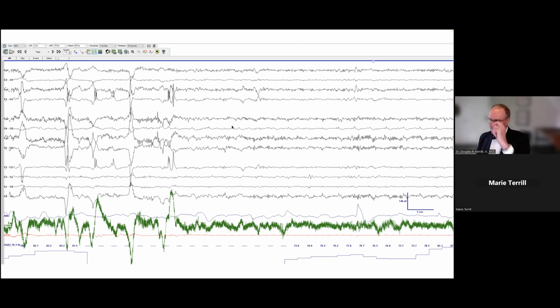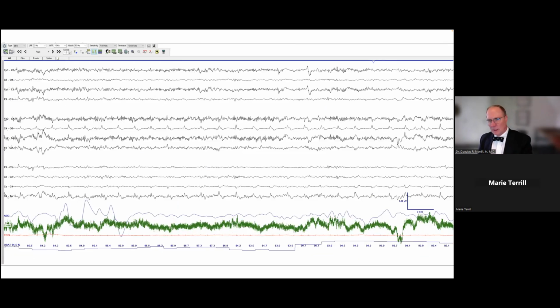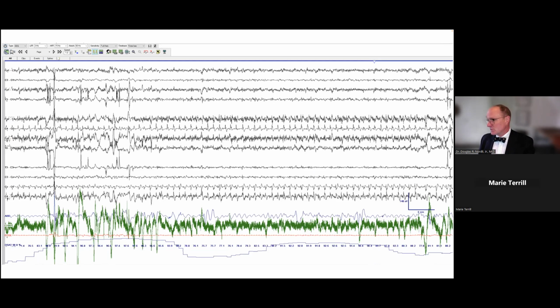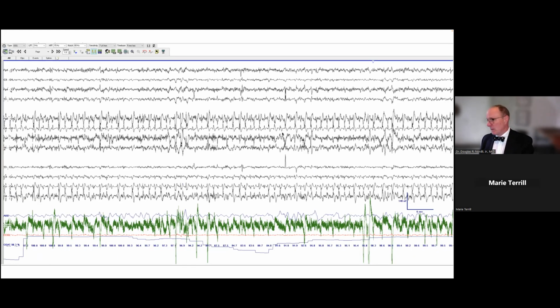So here's an example. Let me show you a page of a newborn. And now you start to see, perhaps in this page, this rhythmic discharge, quite different from what we would see in an older child or adult. It continues like this for quite some time. In this case, it actually changes a bit, but sometimes it will not. It will remain monotonous delta or just persistent rhythmic spikes. And this has more of an evolution, as you can see here, and getting even more dramatic.